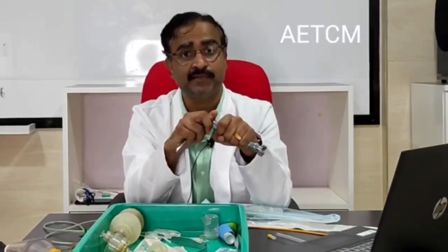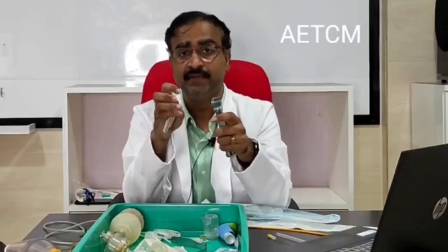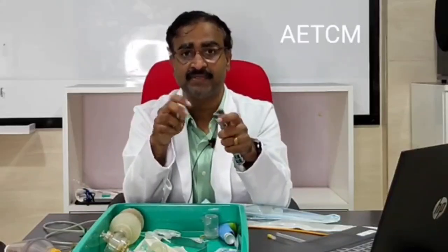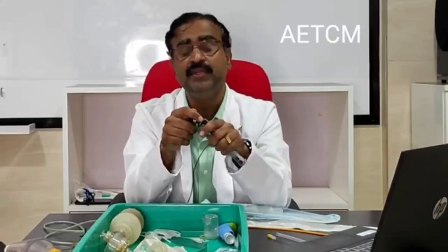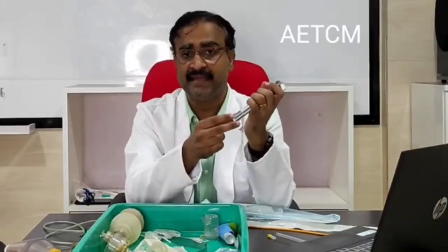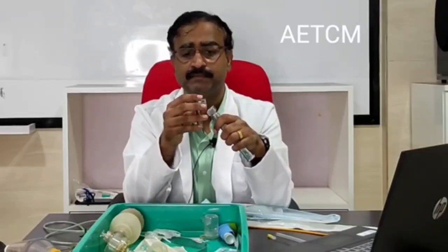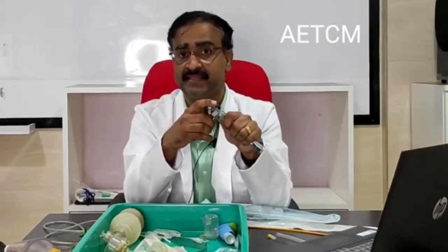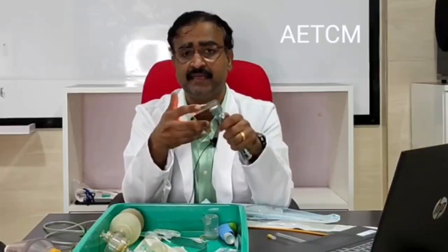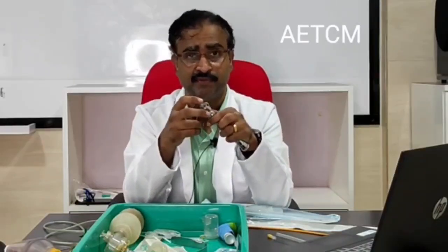So whenever you have a laryngoscope and you are called for an NRP, which is a neonatal resuscitation program that has to be done in the labor room or say in the ER, you need to ensure that the batteries are kept properly and they are in good condition. The lock of the blade is done very nicely, and then when you extend it, you get a light, and then your laryngoscope is ready for use.